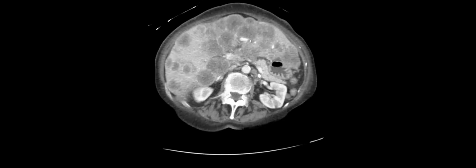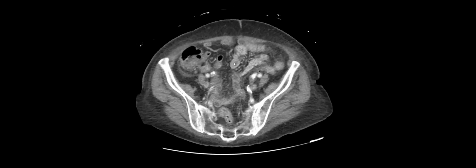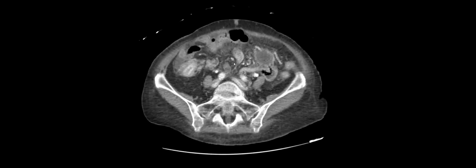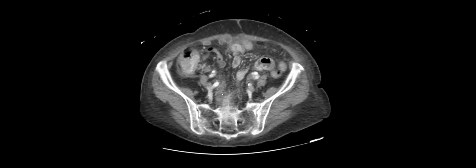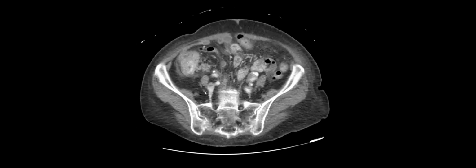Okay, so you can see that there's extensive liver lesions, probably metastatic disease. Is the cecum thickened? Yeah, that thing. Cecum or ascending colon. Do you think that's a mass? Do you think it's colitis? No, that looks mass-like. Yeah, good.